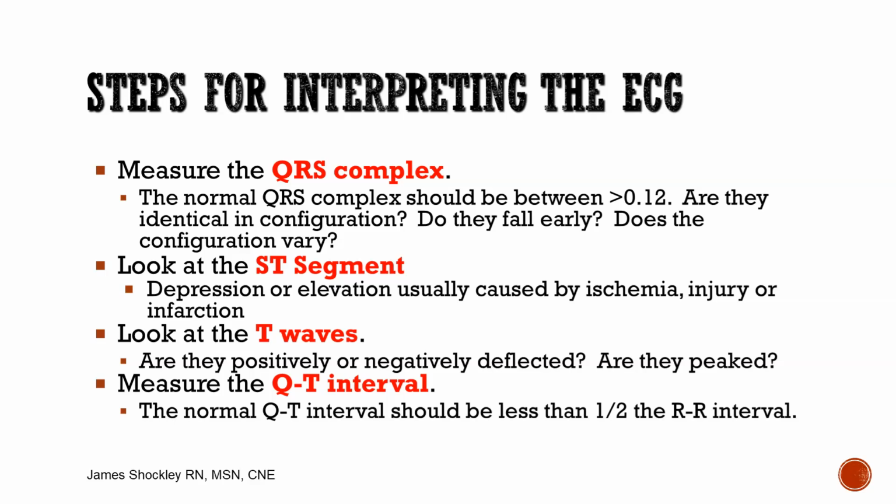I'm going to look at the T wave. It doesn't affect my interpretation, but I want to make sure that it's upright. If it's not upright, the only thing that I need to ask myself is, is it new? Is that T wave inversion new, or is it acute? Because T wave inversion, since it's the I word again, it means ischemia. That's what inversion means for T wave.